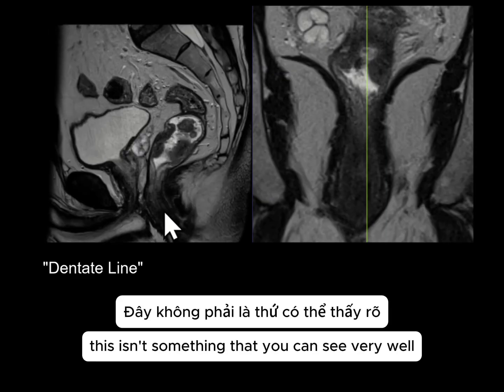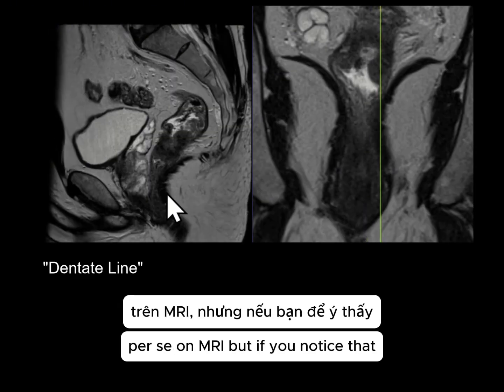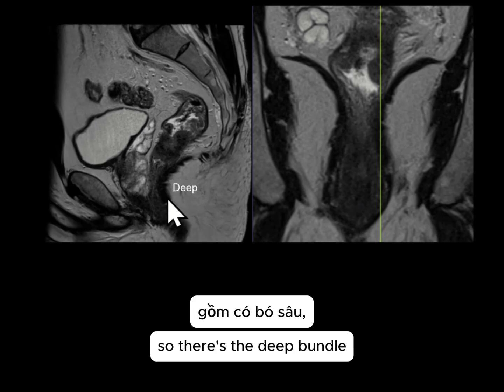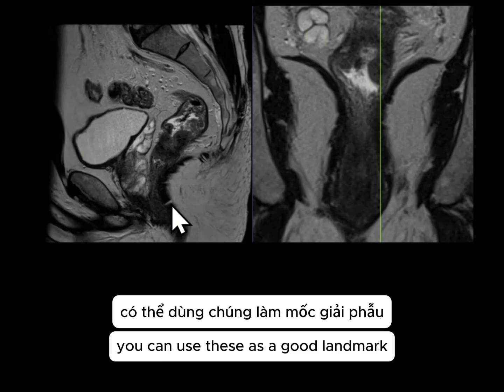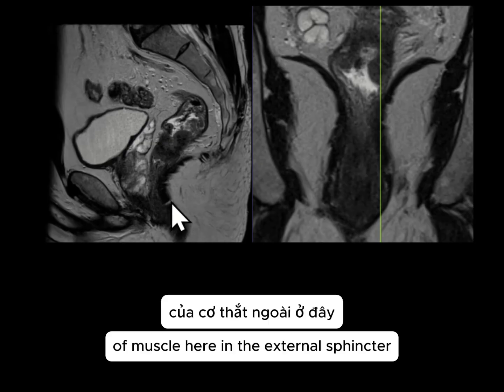This isn't something that you can see very well per se on MRI, but if you notice that the external sphincter is separated into three bundles, so there's the deep bundle, the superficial bundle, and the subcutaneous bundle. The names are less important than knowing that you can use these as a good landmark for the dentate line between the top two bundles of muscle here in the external sphincter.